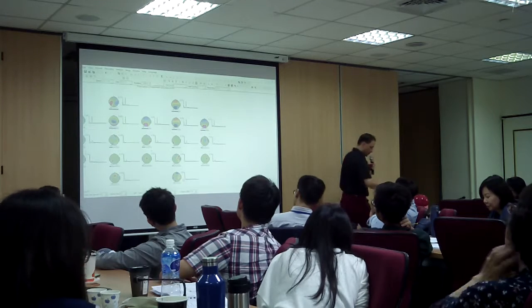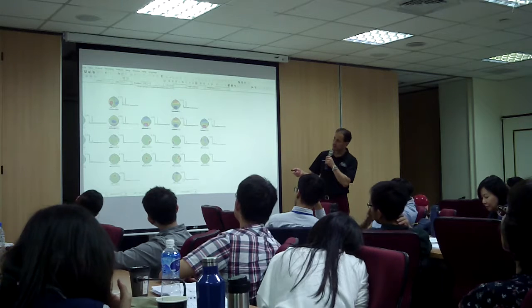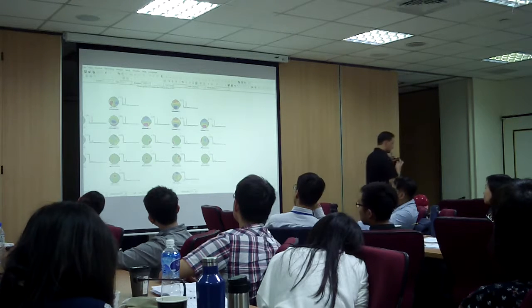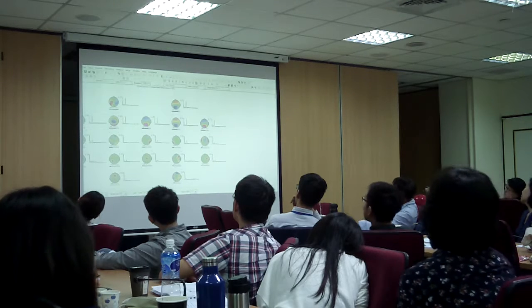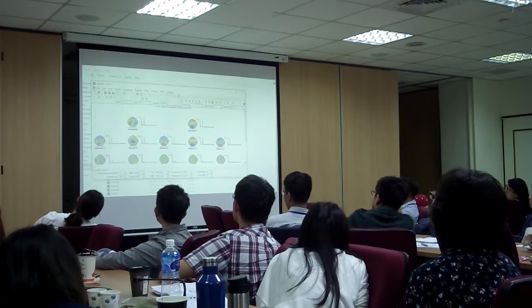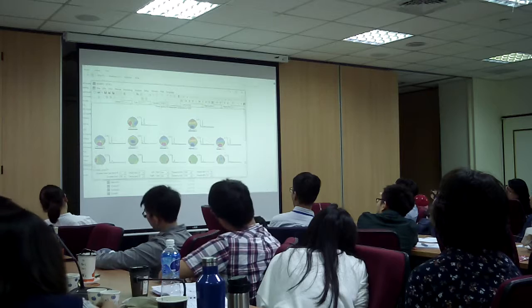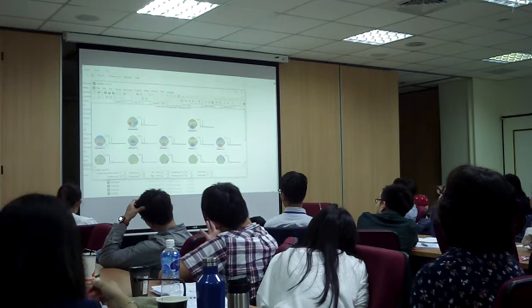So if you see, we got a T3 problem here, and that's about 13%. We have the frontal slowing, which is about 10%, and here we have the occipital slow, which is 10%. So the top 3 topographies are the ones that are more interesting to us. Those are the most problematic.